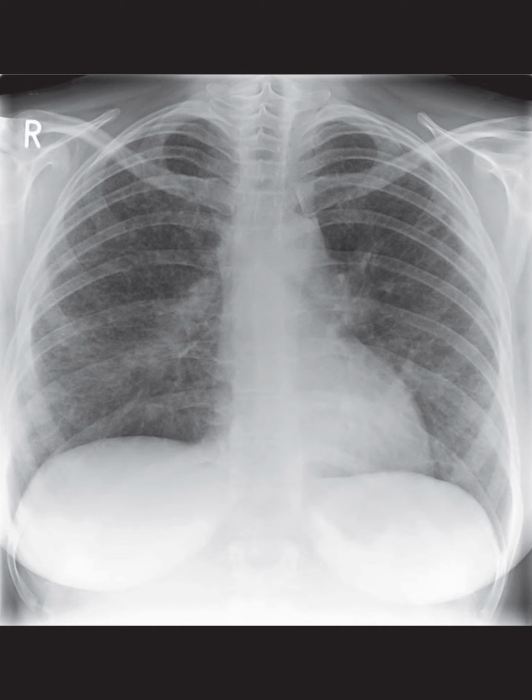What's next? We definitely want to correlate these findings with the patient's clinical picture and possibly consider a biopsy to confirm the diagnosis. It's all about piecing together the full story.